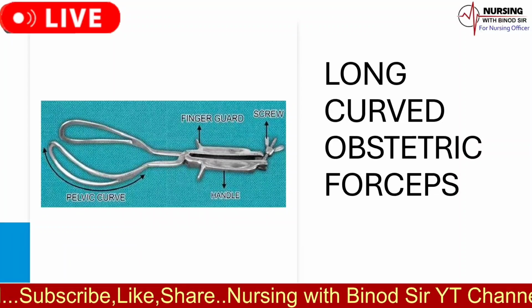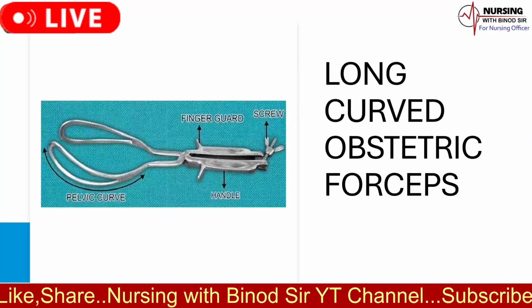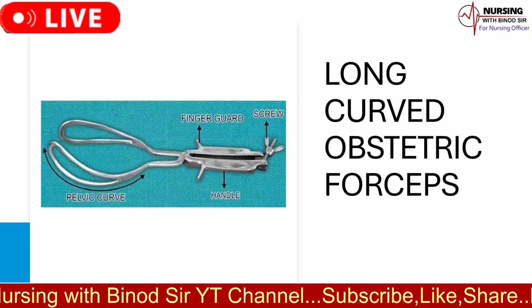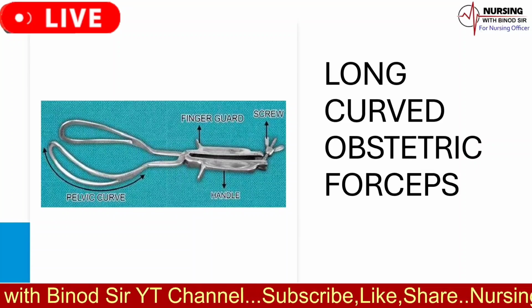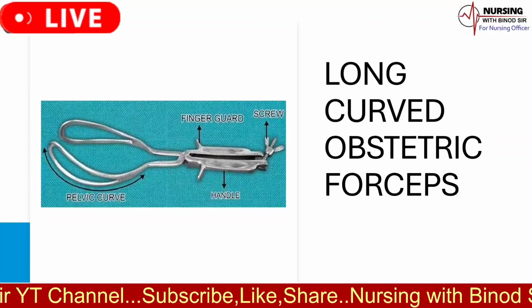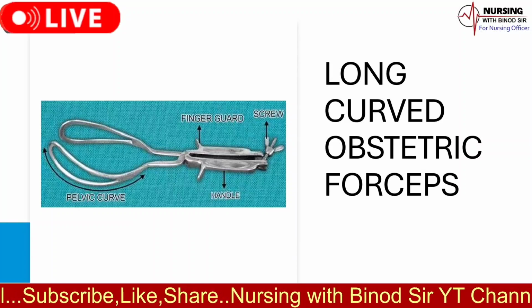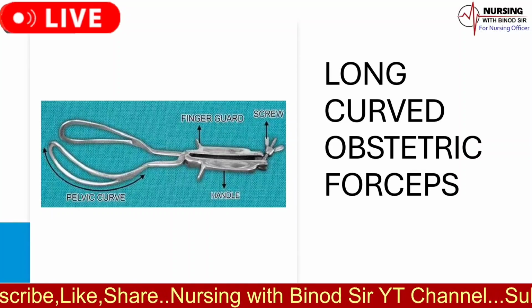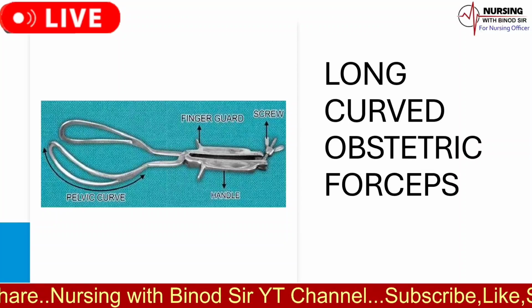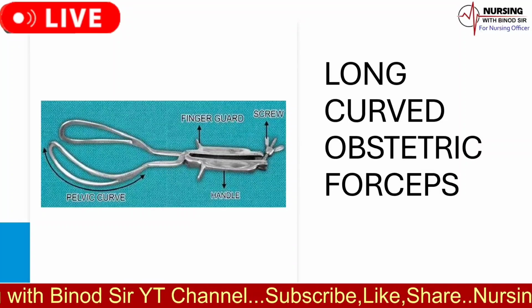safety. 6. Breech deliveries. Long curved forceps are sometimes used to assist in breech deliveries, especially if the baby's head has already passed too. 7. Complication management. They are used to manage complications like shoulder dystocia, wherein they help maneuver the baby's body to ensure a safe birth. 8. Reducing cesarean deliveries. By enabling assisted vaginal delivery, these forceps help avoid the need for cesarean sections, thus reducing associated risks and complications.